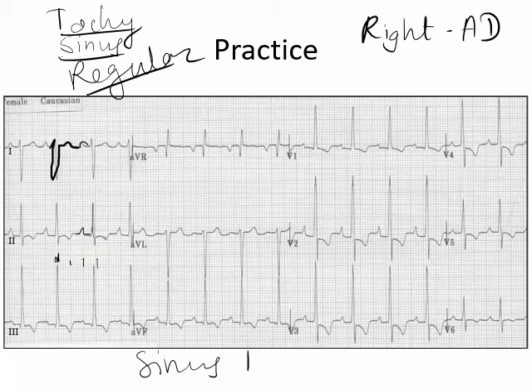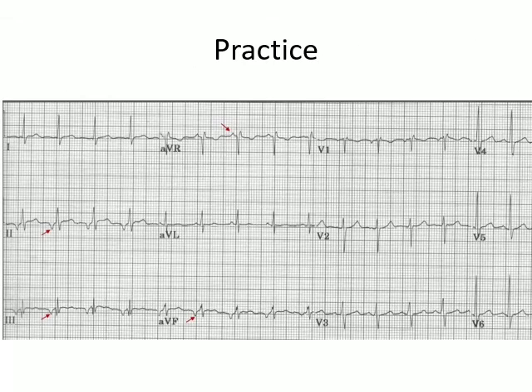Sinus tachycardia, what is it? We'll talk about it in detail in our lectures on arrhythmias. Let's have a look at this ECG. Now to look for rate, we see that our first QRS, for example, comes just after this dark line. This would be 300, this would be 150, this would be 100. So we can conclude that the heart rate is slightly more than 100, which means the patient is in tachycardia.